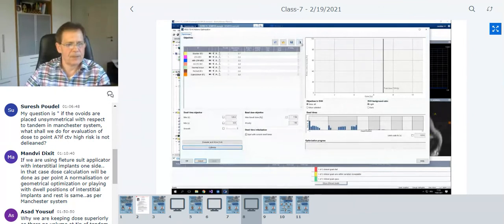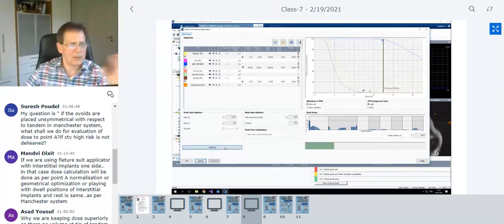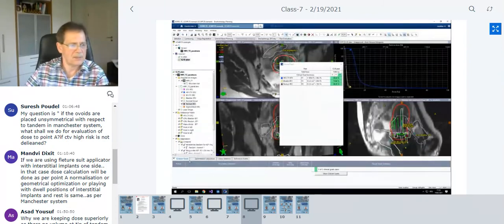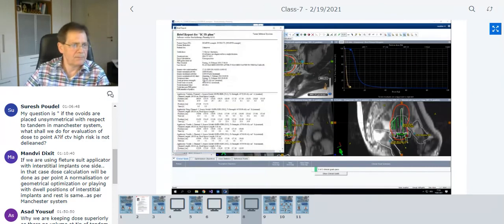So now we'll try and modify the dose with an inverse plan, or inverse planning. So I use my clinical goals now. I add this to my optimizer and use these clinical goals to optimize the times. So I don't adjust anything else, but I just optimize here to do it quickly. The optimization is completed. The system tells me, I say, okay, and just take it as it is. You see that the clinical goals are already fulfilled. So the system has changed the 12 times so that I fulfill these clinical goals. It has changed the isodose so that I can fulfill also the bladder dose. I'm just looking quickly to the total time. Total time is now less than with the standard plan. It was 500 or 499. Now we have a little bit less than this.